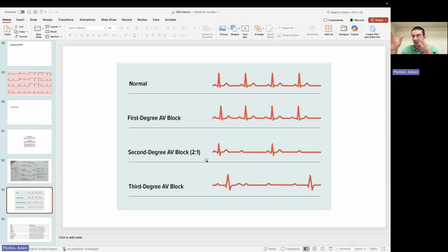And it doesn't have to be like a set pattern. I said normal, drop, but it kind of depends on the patient. But you have a normal PR interval, a normal PR interval, and it's just always normal until out of the blue you drop a beat, okay? And so you have a P, but there's no QRS that follows it. Whereas in second degree type 1, we have a prolongation of the PR interval to the point that we then drop a beat, okay?